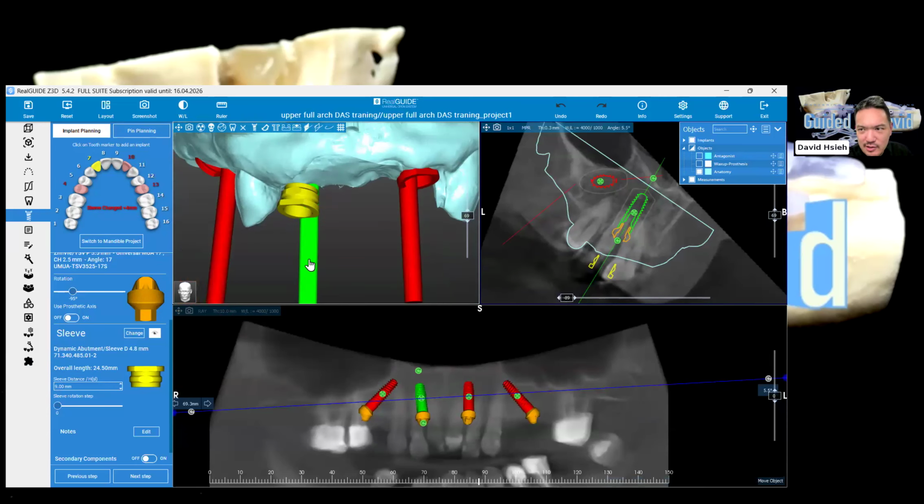But you come back to me and say, hey, David, wait, if you raise the sleeve, doesn't the implant get raised as well? So that's another cool feature about that guided sleeve. Actually, when you drill, it's raised by 4, like from 5 to 9. You just select a drill, for example, 10. Now you just drill for 14, and that will be exactly the same depth.